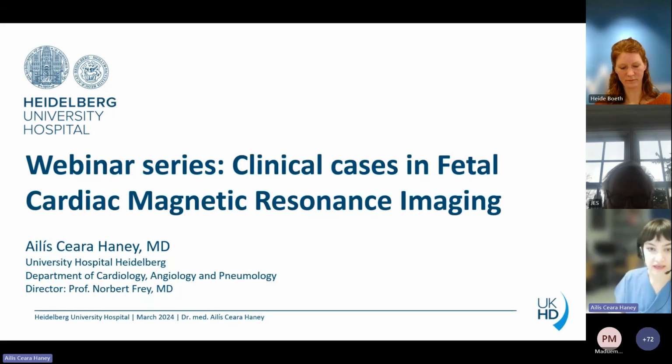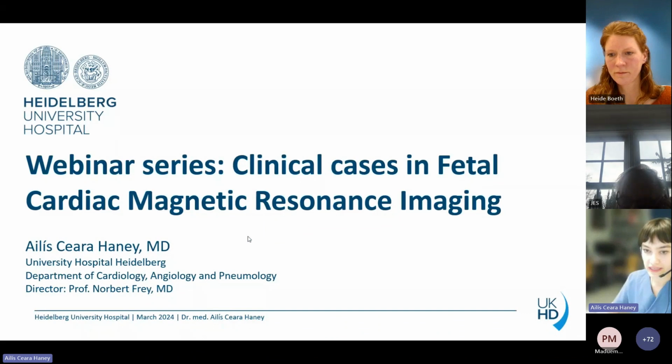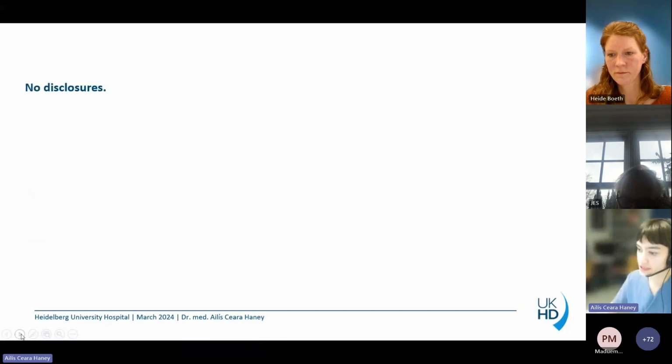We're still developing it, but we perform solely fetal cardiac MRI. So we really take just sequences for the heart. We haven't performed a huge number of exams, but I just want to present one case that really changed clinical management for the patient.